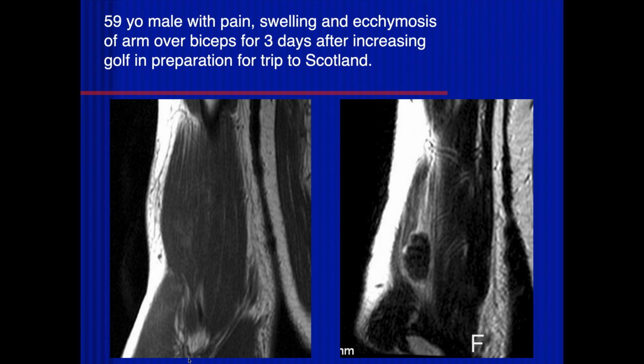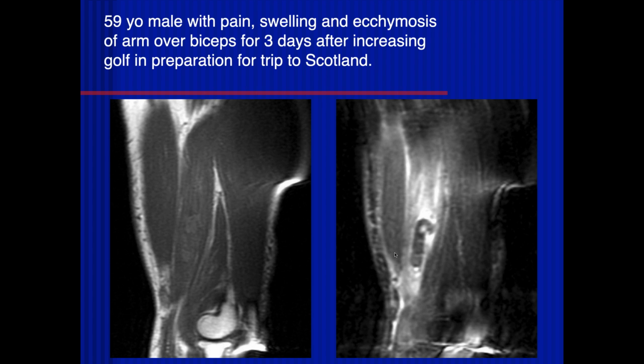So it's quite a ways from the elbow. It's proximal to the elbow. We can see, yeah, there are other images, T1 weighted images here. Here you can see the elbow down here, and then signal changes here.